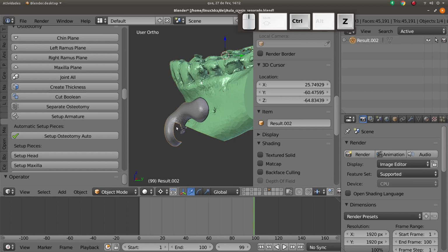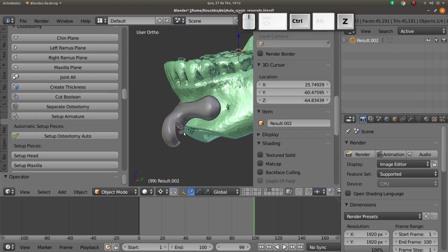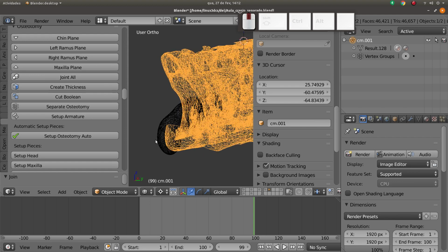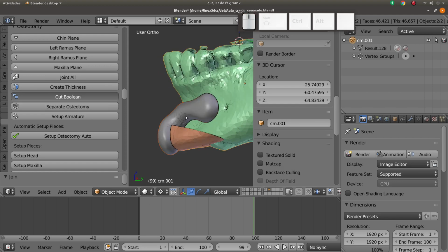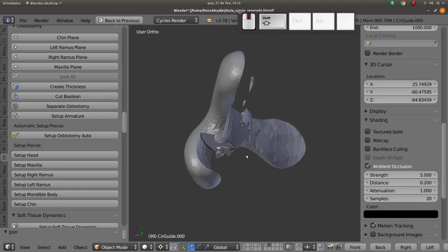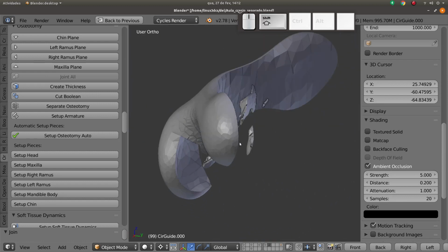I will try to come back until here. I will put these two in join all, and this less this. Ha! Okay. Sometimes it happens. This computer doesn't have respect for me.